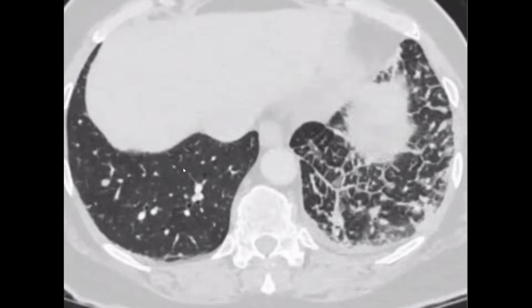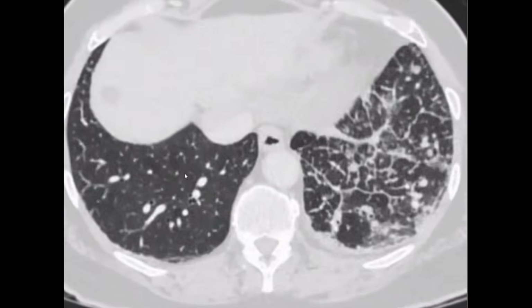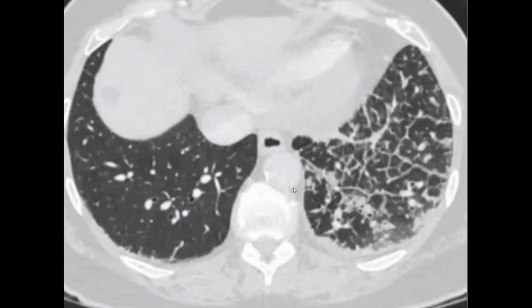So it appears to be confirming lymphangitis carcinomatosis as your diagnosis. Yes, it's confirming that. Very nice, you are perfect. Really, you got the idea from the chest X-ray.